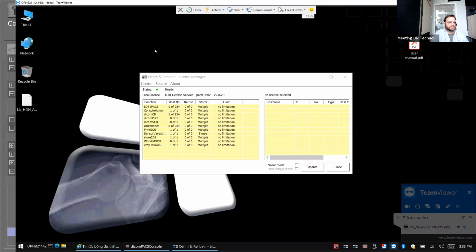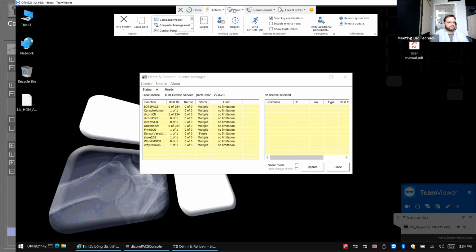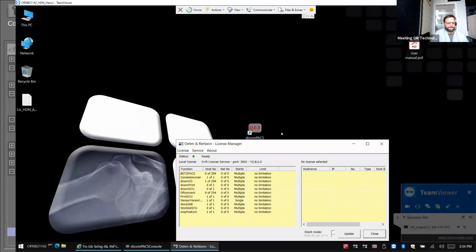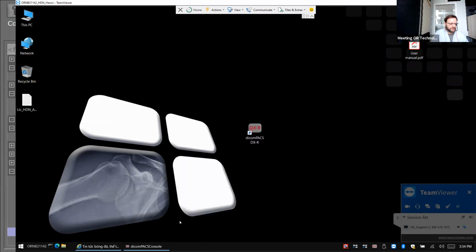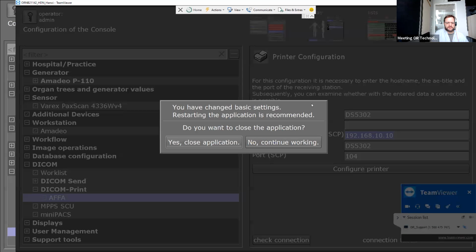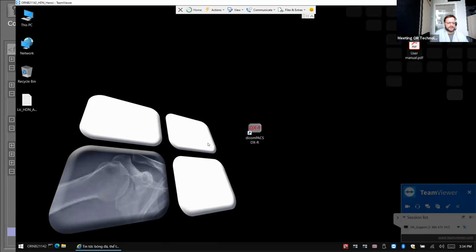Good. So after that, I would restart the software to get all the licenses.